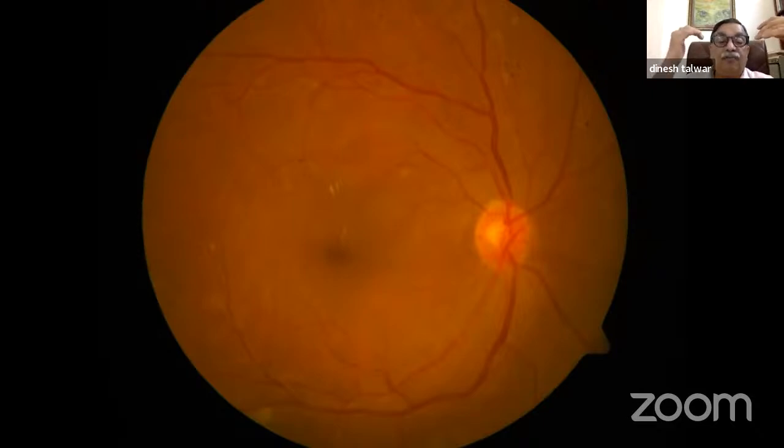Now let's say even this is too much. What about half this diameter? That's 750 micron. Ask Gopal whether he thinks 750 micron away from the fovea is safe. Is 1000 micron safe? If you're putting very small grade 2 burns, 50 micron burns, 1000 micron from the foveal center, it's not completely safe, but it is acceptable.